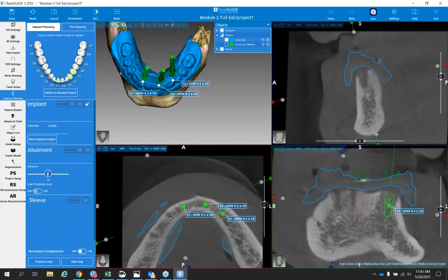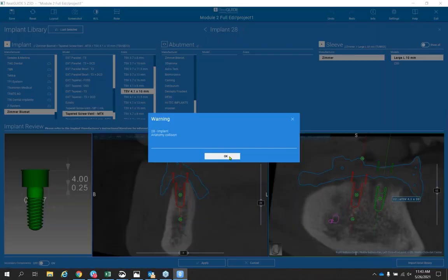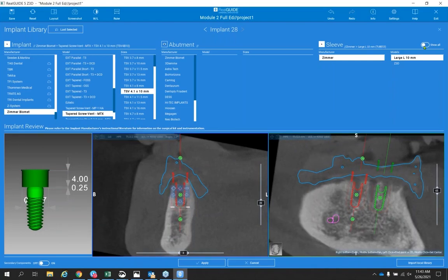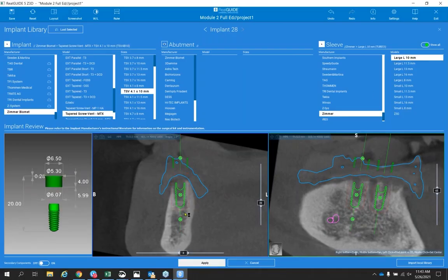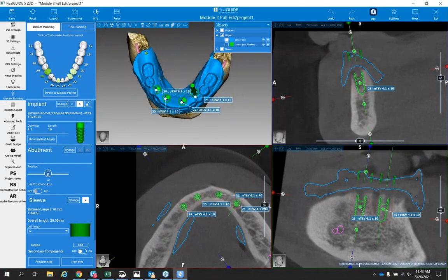I'm going to cross my arch, be this position. We'll call it 28, right, when we were setting this up. So I'll show you how it's easy to change the implant nomenclature too. If you're not happy with 28, you want to label it 27, I'll show you some tools for that. Okay, all right, so we have our implants in our prosthesis.